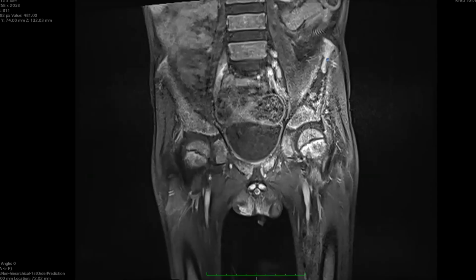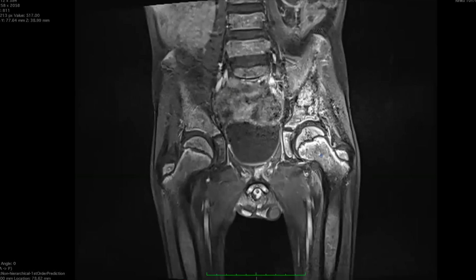So this actually is a case of diffuse marrow involvement with secondary infection. This diffuse marrow enhancement is actually osteomyelitis, and the non-enhancing or the subtly peripherally enhancing areas are intraosseous abscesses. This came out to be a case of leukemia, B cell ALL, in an 11-year-old child, and these were fungal abscesses in this kid.